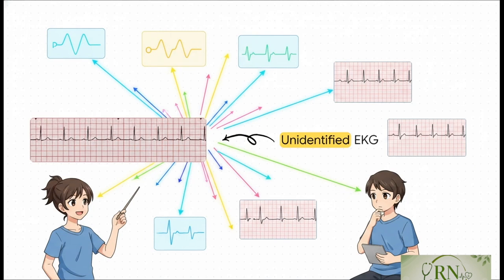Take a look at this. This is our raw, unidentified EKG strip straight from the source file. Just kind of absorb it for a second. You probably feel that instinct to try and solve the whole thing at a glance, right? I mean, you can see the big repeating spikes, the smaller waves rolling in between, the grid paper, but trying to take in the whole picture at once is honestly just overwhelming. To really solve this clinical mystery, we can't just stare at it and hope the answer magically appears.